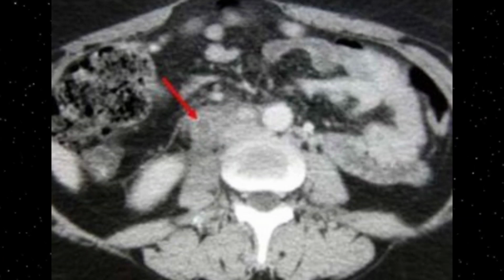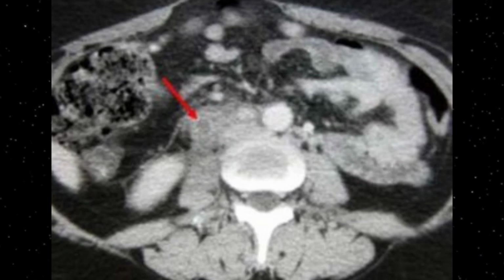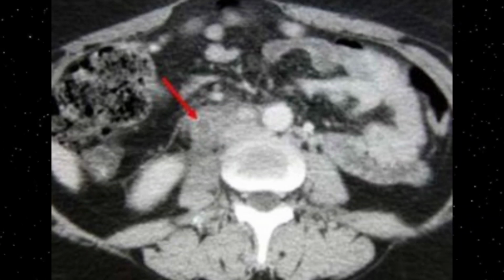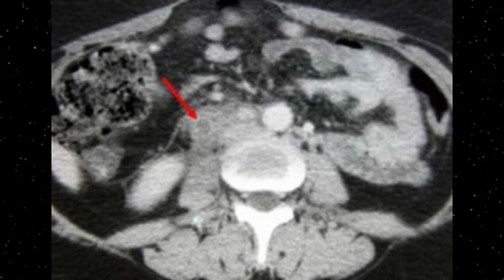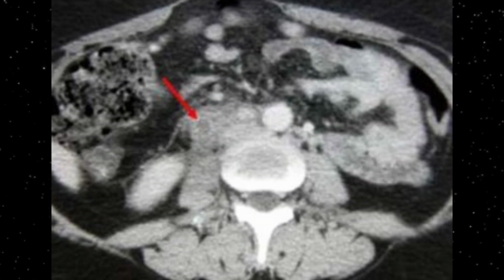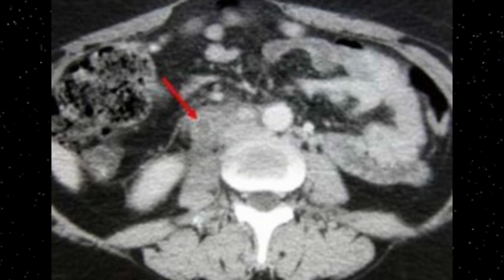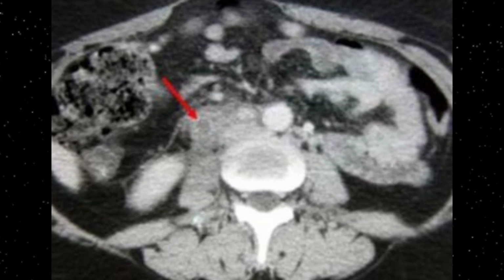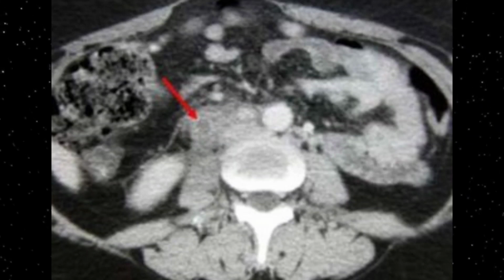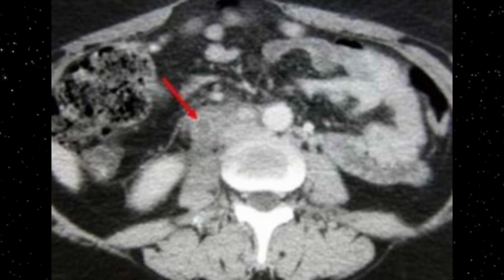You might have noticed that whatever images you have seen were from the right ovarian vein, because the right ovarian vein is 90% involved. One of the images was of left ovarian vein thrombosis, which was because of some other systemic abnormalities. So this is a clear example of ovarian vein thrombosis on the contrast enhanced CT axial images.